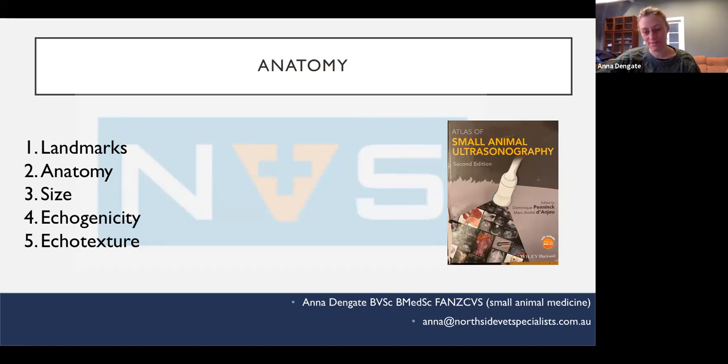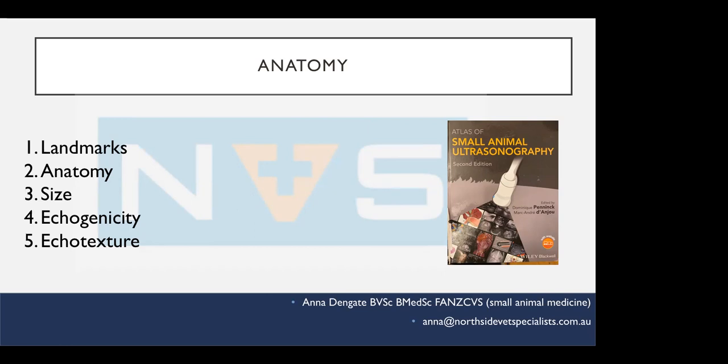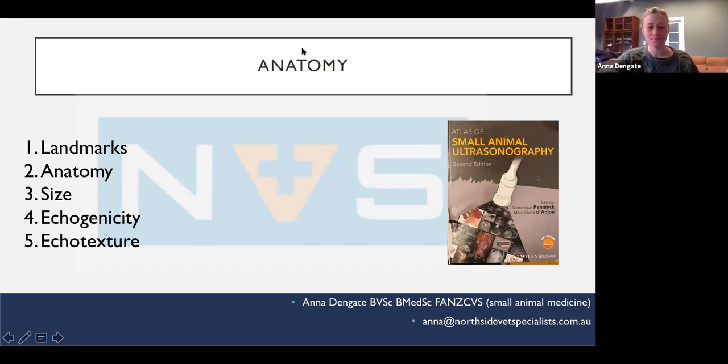Excellent. So the falciform fat should be hyperechoic in dogs and cats to the liver. In obese cats, the liver is often hyperechoic to the falciform fat. So the echogenicity of the fat varies on how much fat there is, obviously. So that relativity, we lose that a little bit. So I usually get a picture of the spleen, picture of the liver, put them side by side with the same gain and settings on, and just see which one's darker, basically, to assess the echogenicity of my liver.